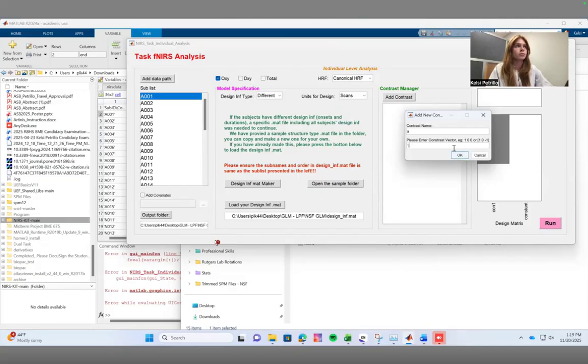You have other options here, so the important thing to note, first of all, is that you'll always define the contrast for the conditions first, and then the last value that you type should be for your baseline. That's why I put 1, 0 as opposed to 0, 1. And it might be the case even that you have some situation where you expect to actually see deactivation due to your condition. So you would put -1, 0. If you have multiple events, you can type multiple things here.